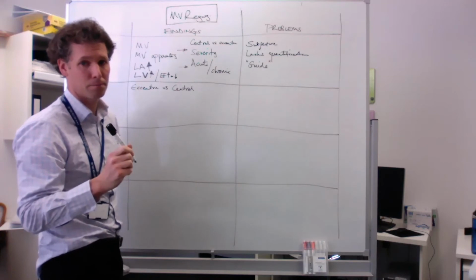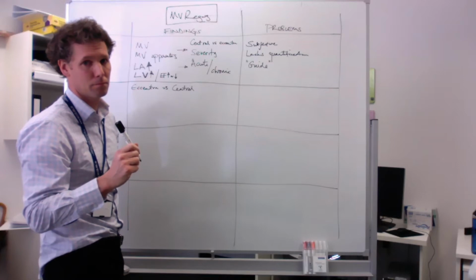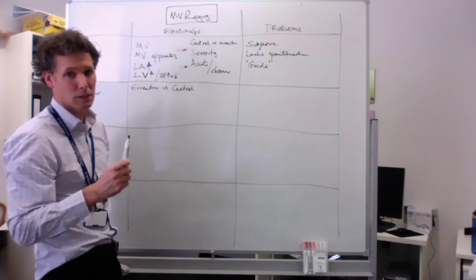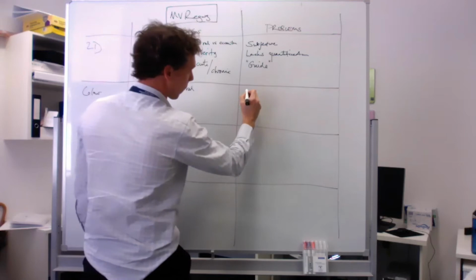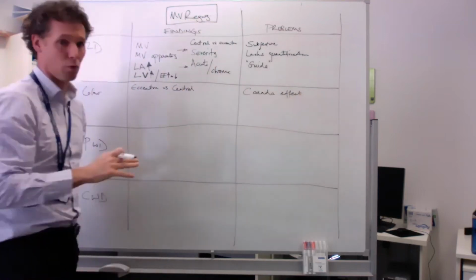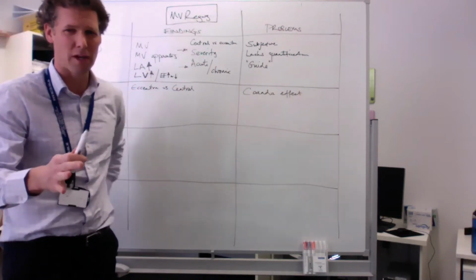Why? Because you're going to have blood going all over the place and it's difficult to see exactly what's going where. Not with the eccentric one, you don't? I'm looking for a buzzword. Wall hugging jet. Yeah, nice. That's the eccentric bit, the wall hugging jet. And it's the Coanda effect. Do you remember what that's about?